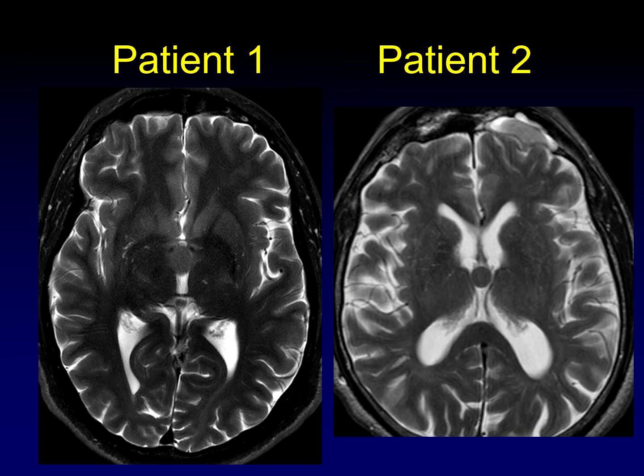All righty. In each of these cases, we have a spherical or ovoid anterior third ventricle mass. So how do we tell the difference between these two lesions? Well, it might be kind of difficult on the T2 weighted sequences alone. Maybe on this one you can see a little more CSF around the periphery, and on this one it seems to adhere to the brain itself.